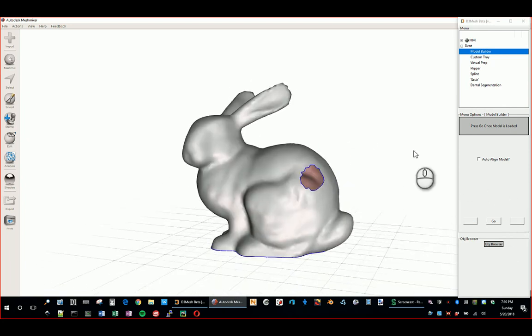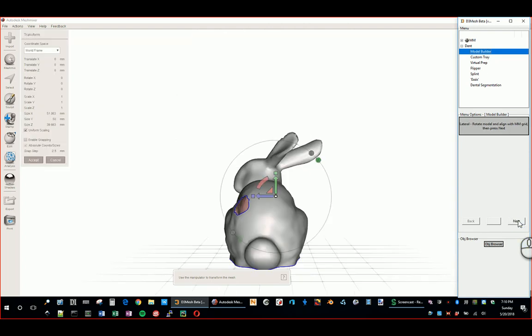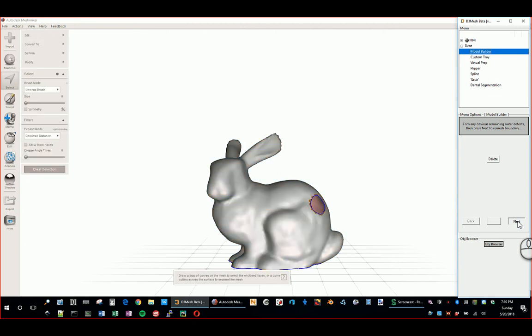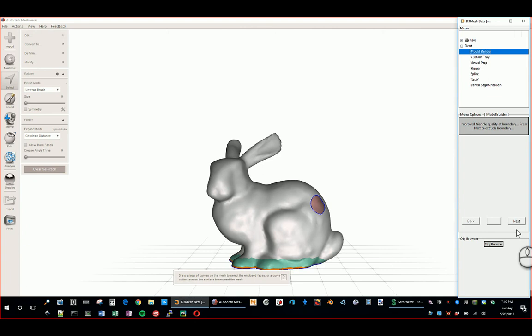And as I'm doing this, I'll show you how it works here. In the background, the bottom section here, where it says Object Browser, is something where, for me, it's just a personal grief, I guess. The Object Browser that's built into Mesh Mixer is a bit clunky and it's hard to organize. It's just difficult to use, and it could be so much better.